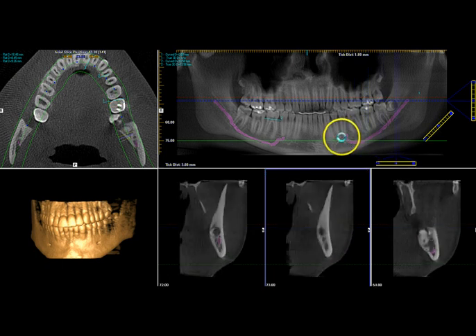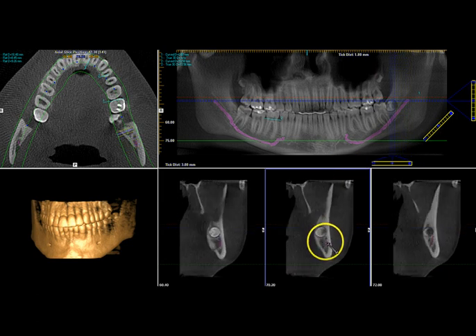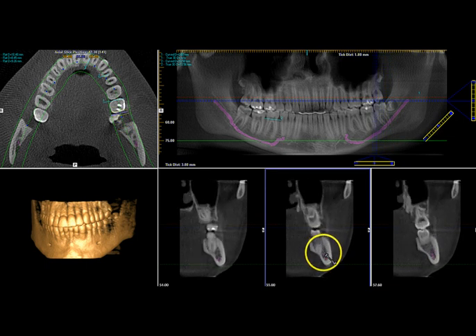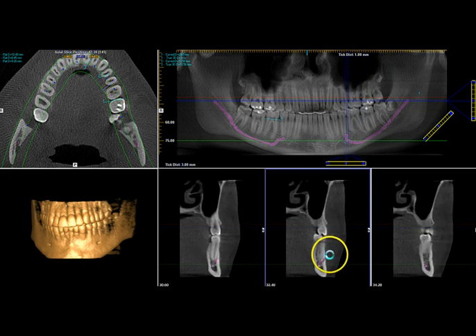And let's start out with the path. So you can see here's the mandibular foramen, the nerve is in there, and look how it's traveling down, right down the middle, and then slowly go from the lingual, and it'll go to the buccal, and exit the foramen right there. See how it's exiting? And you can see the path right here. And remember, we talked about this line represent here, the other two boxes are here. So not that you just get the one-on-one relationship, but you can also get the exact path and orientation of the nerve as it crosses the mandible from the foramen to the foramen.